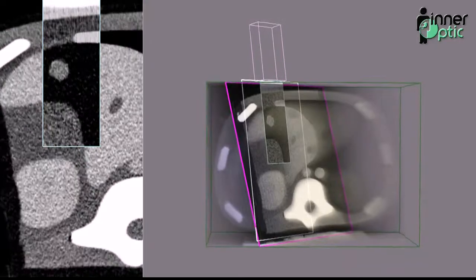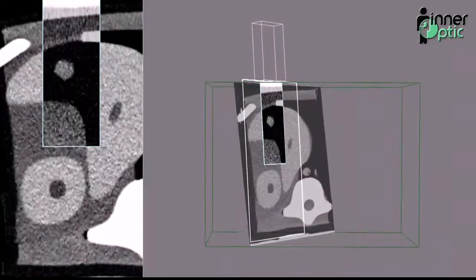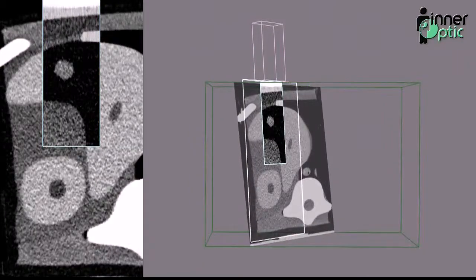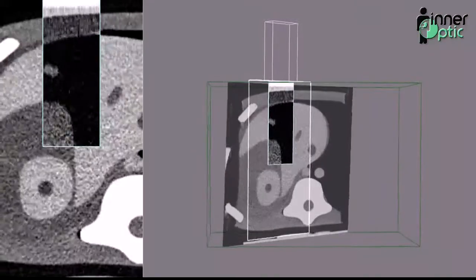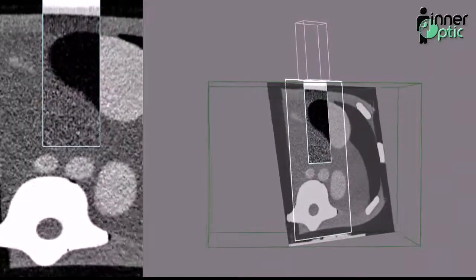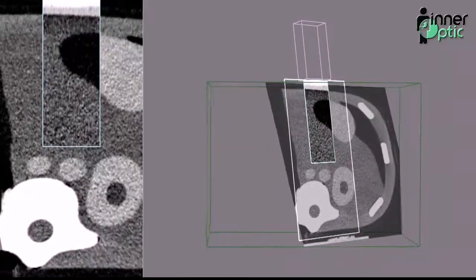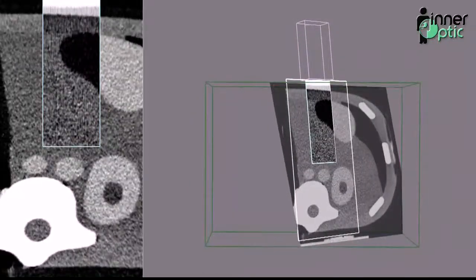We also have an intraoperative annotation capability. Rather than being used with a mouse at the workstation, this is intended to be used with a draped touchscreen in the sterile field that the surgeon, for example, could even use with a bloody finger. Here I'm going to annotate. I'm going to circle the right kidney with my finger.